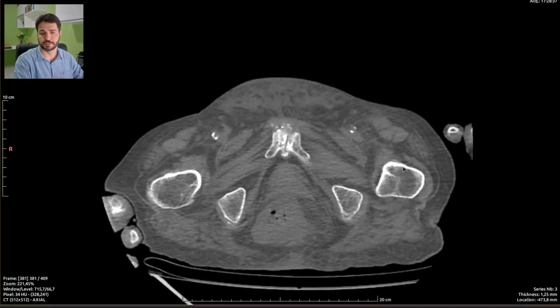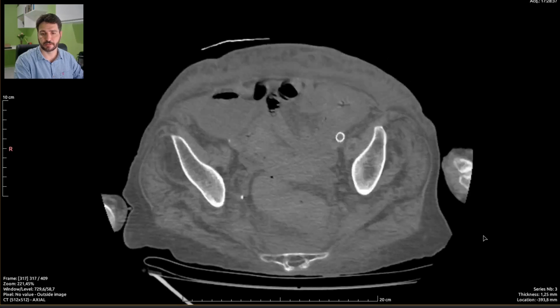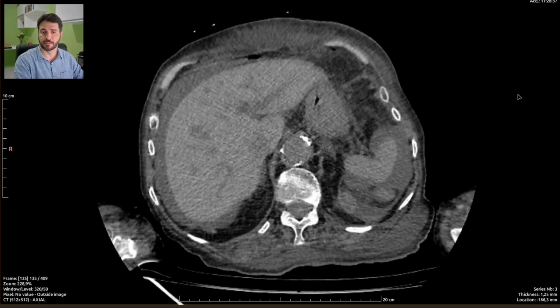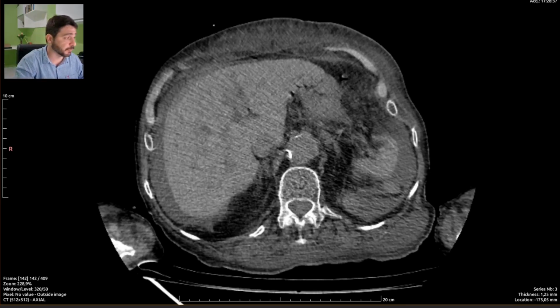So, this video can be of some use for you guys that are starting out on this radiology thing. So let's start, because as you guys know, exams won't report themselves. Yeah, very badly done exam, no contrast enhancement, and severe disease all over the abdomen. Of course.